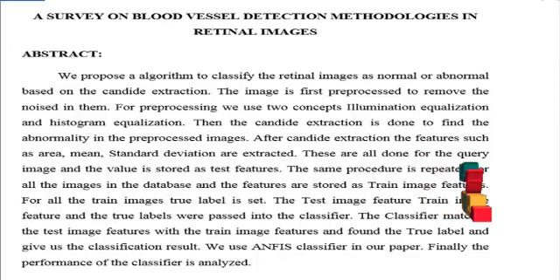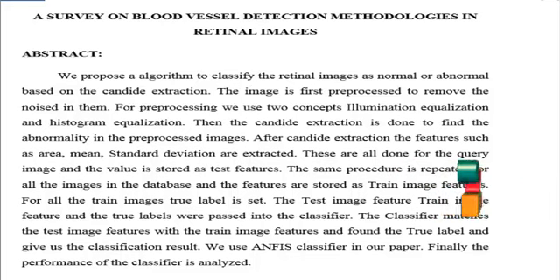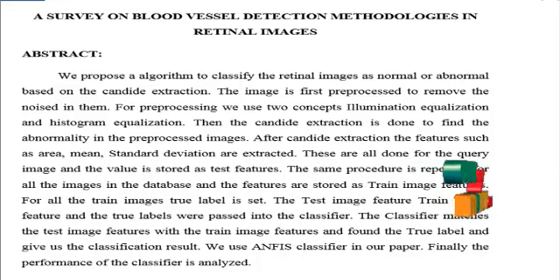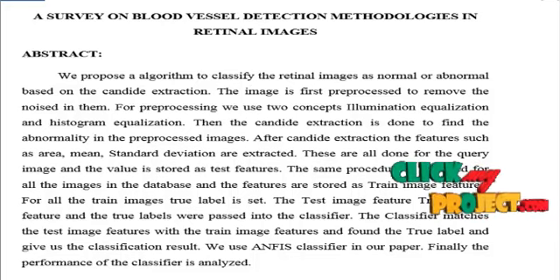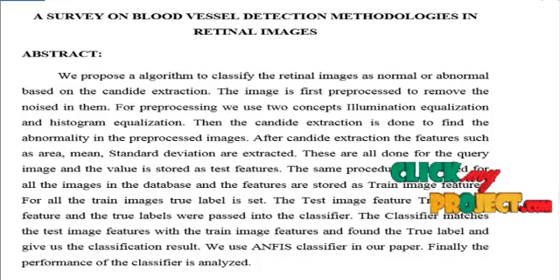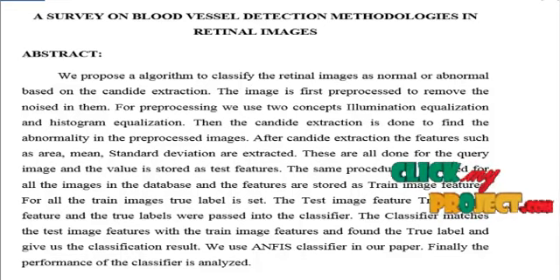The test image feature, train image feature and the true labels were passed to the classifier. The classifier matches the test image features with the train image features and finds the true label corresponding to the test image and gives us the classification result. We use ANFIS classification in our process. Finally, the performance of the classifier is analyzed.